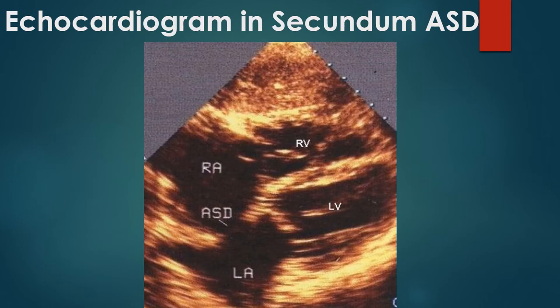Echocardiographic image from subcostal 4-chamber view showing an ostium secundum atrial septal defect. Subcostal view is the ideal view for imaging atrial septal defect to exclude false echo dropouts which may be seen in apical 4-chamber view. This is because the imaging ultrasound beam is perpendicular to the septum in subcostal view, while it is parallel to the atrial septum in apical 4-chamber view.